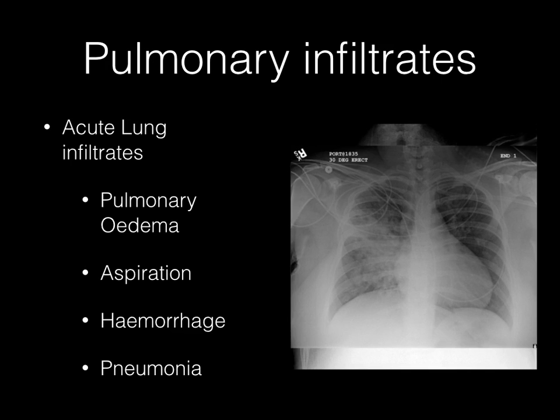And in most cases, the initial damage is all because of chemical infiltrates, and later on, as there is further establishment of damage, this can result in secondary infection, and this can cause what is called an aspiration pneumonia. The chest X-ray pretty much demonstrates the same finding of airspace opacification in a lobar or segmental distribution. And on occasion, the airspace opacification may be bilateral, but is usually perihilar, and on most occasions, it is asymmetric.